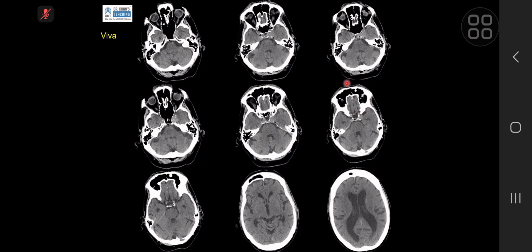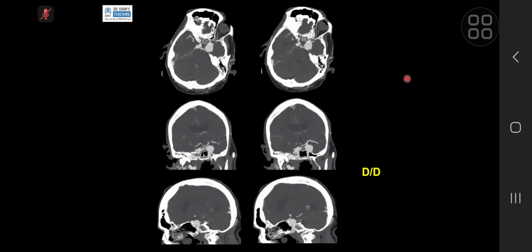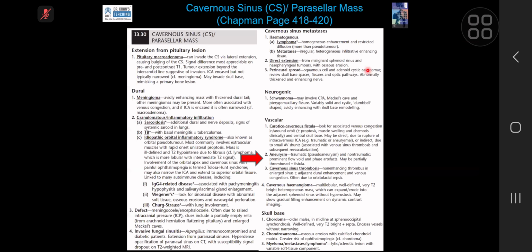Look at this one. This is a favorite in the exam. You know, the para-cavernous sinus or parasellar region is a very important differential diagnosis. If you see here, something is there. And when we give a contrast, this is a CTA study, and you can see the cavernous and the supraclinoid portion of the internal carotid, there is a large aneurysm. And that is why in your differential diagnosis of cavernous sinus or parasellar masses, other than all of these things, vascular, as in aneurysm, is there, and always remember it because it is quite a favorite.